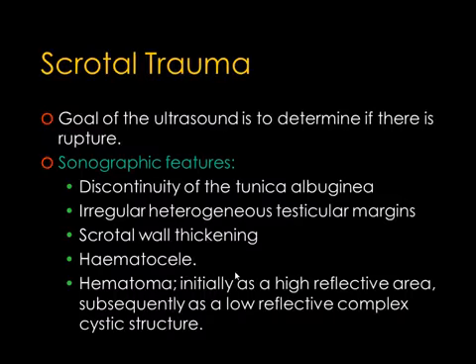Scrotal trauma. The most important goal of ultrasound in testicular trauma is to determine if there is rupture, because rupture of the testis is a surgical emergency that requires immediate diagnosis. On ultrasound, we see discontinuity of the tunica albuginea, irregular heterogeneous testicular margins, scrotal wall thickening, and hematocele.